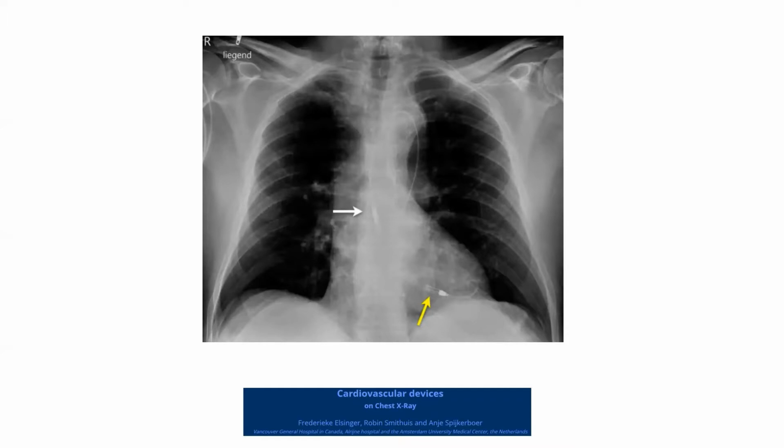High-risk PCIs, cardiogenic shock, or mechanical support as a bridge in patients with severe heart failure. So this is Impella. So you now know the personalities of these devices and how they look on X-ray.